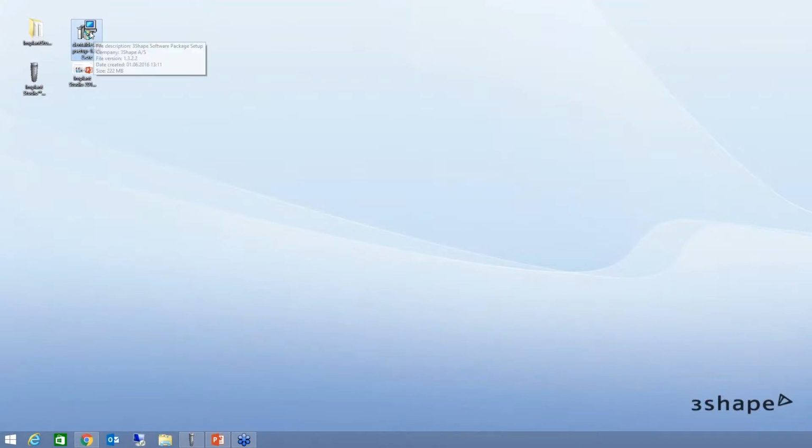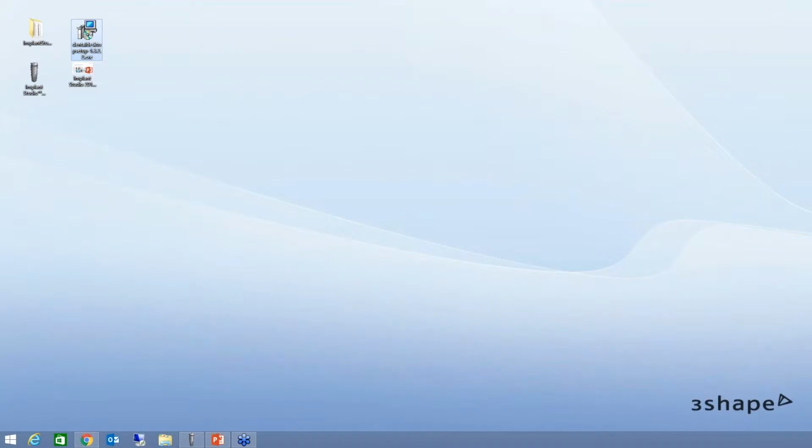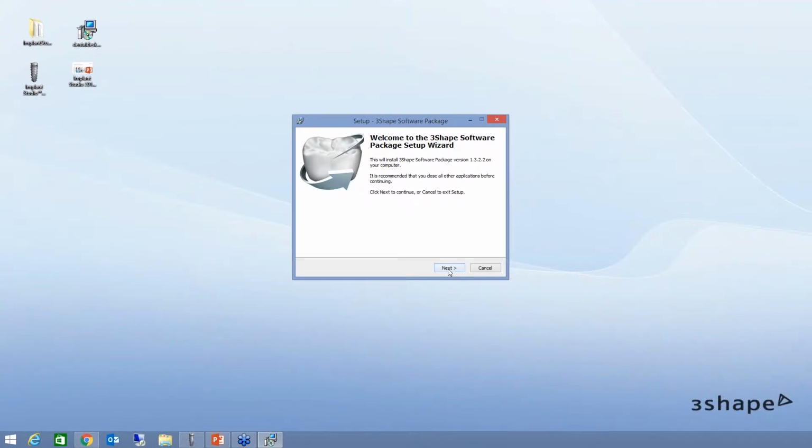So this is the installer. We right-click it, choose Run as Administrator. And then here we click Next.